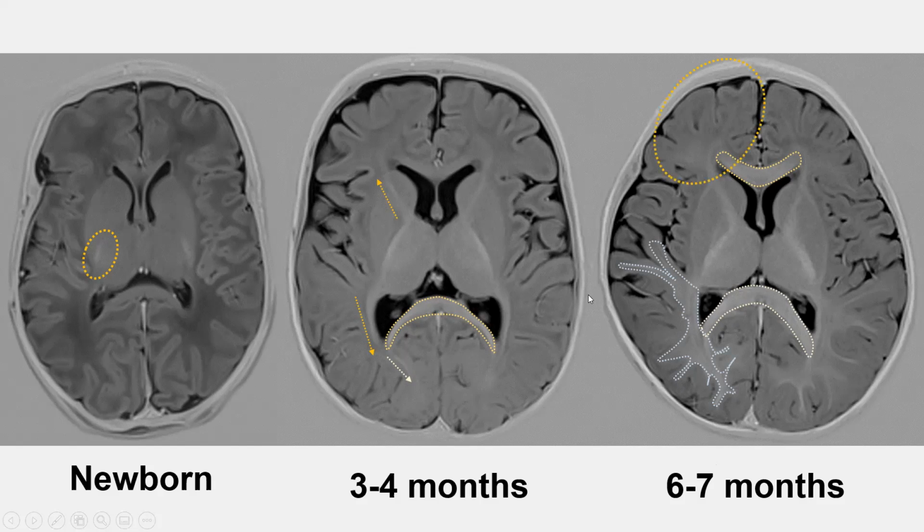Compare that with the frontal lobe and notice that there is no myelination or barely any myelination yet to be seen in the frontal lobe.